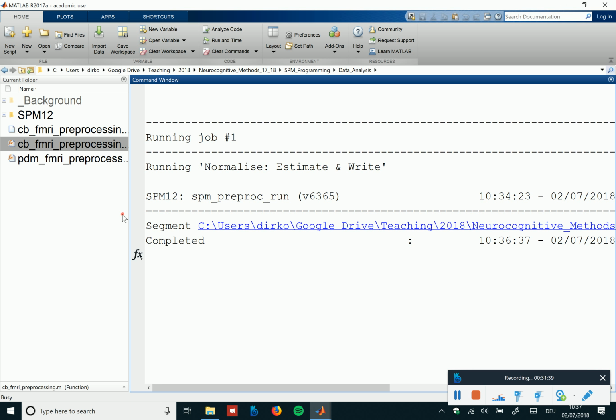How much more do you want to standardize than using the SPM defaults? So in that sense, it's already standard. This is so far from doing any actual cognitive and research work. This is just basically turning on the machine to do some image pre-processing.